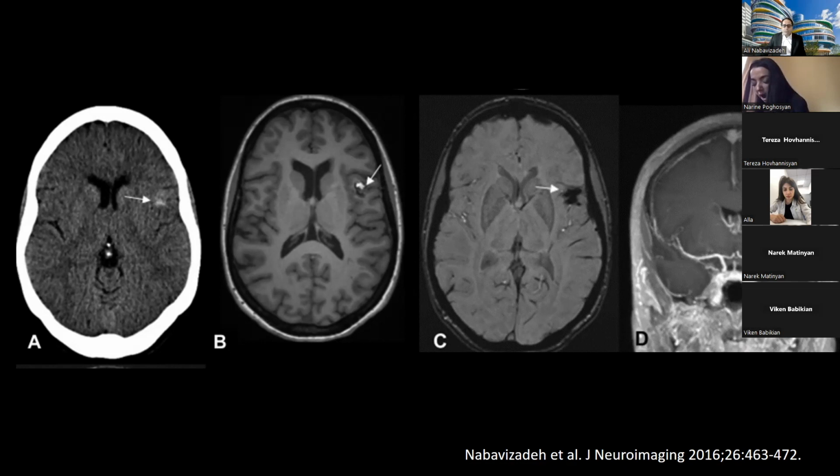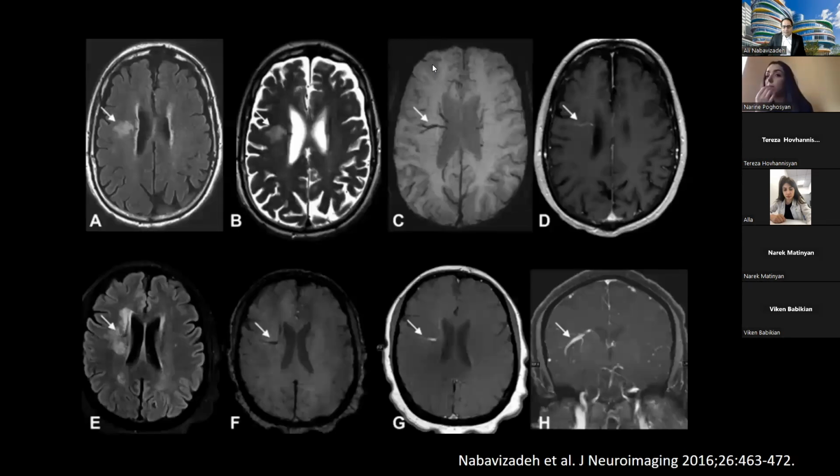And frequently they are also associated with cavernoma, which you can see here. There is a large DVA in the opercular region. There is also a cavernoma, and cavernoma can be recognized by its typical appearance because it has various blood products of different ages. And on susceptibility or GRE images, it causes significant blooming. On CT, it's usually hyperdense. So DVAs and cavernomas are frequently seen together.